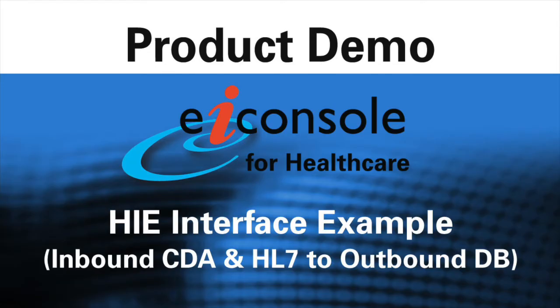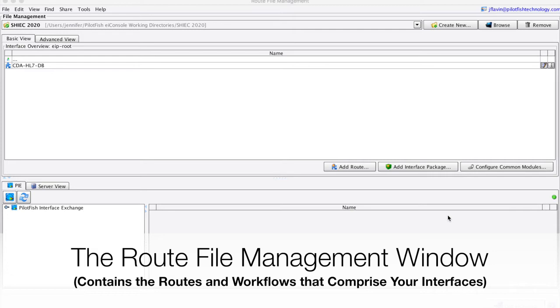This is a demonstration of the eiConsole for healthcare. In this demonstration, we'll be taking in some CDA as well as some HL7 and sending that on to a database.